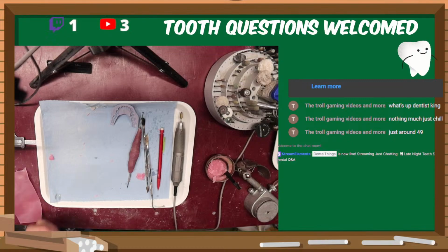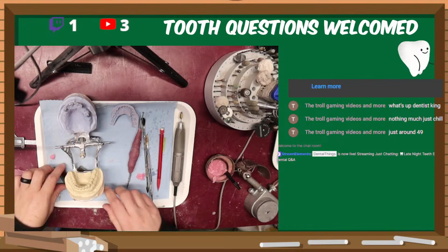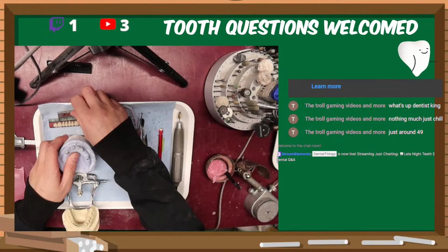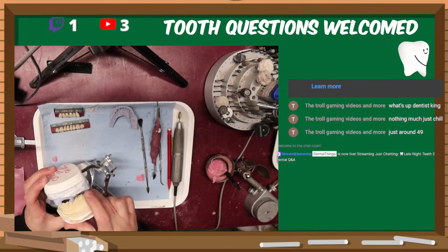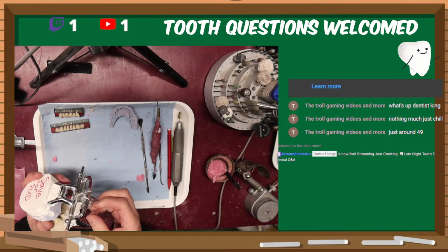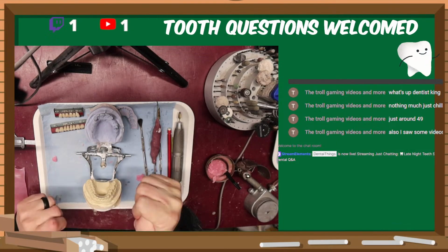Alright, so I got what I need here. Cool. So we'll use a couple of these. That gives me just about everything I need. And let's see if I got the bite down already. I do. And my pin is set, so that's good stuff. Now we just got to get stuff to fit. I know I don't have a lot of room.